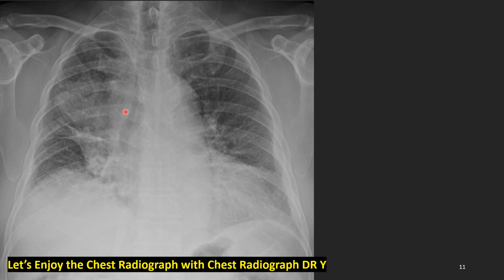This means there are many mediastinal lymph nodes here, 2R or 4R lymph nodes. Also we see the elevated right hemidiaphragm with unclear border. Maybe he has some phrenic nerve invasion. It is strongly suspected. And he has another pathology, cardiomegaly. This is the usual manifestation of lung cancer, especially large cell lung cancer.